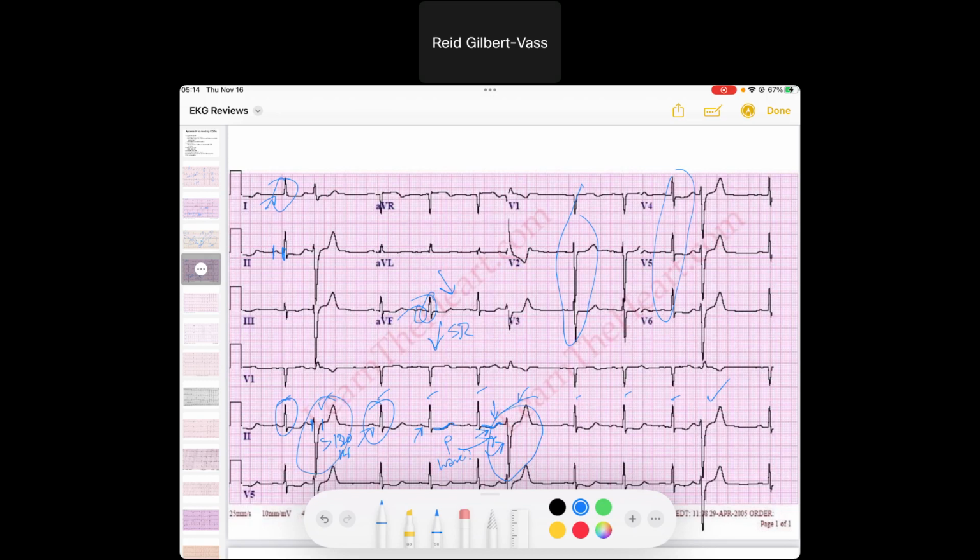Same thing here. And so these would be PVCs, which would make sense because they're wide. Remember, PVCs are from the ventricular myocardium, and they don't take the highway system throughout the ventricles. They're wide and they're premature. They're happening early when you look at the R-to-R intervals. They're happening before the next beat should occur. So those are premature ventricular contractions, and the morphology is the exact same every time. So we know that all of these PVCs are coming from the same spot in the myocardium. So you could even say that these are unifocal PVCs.